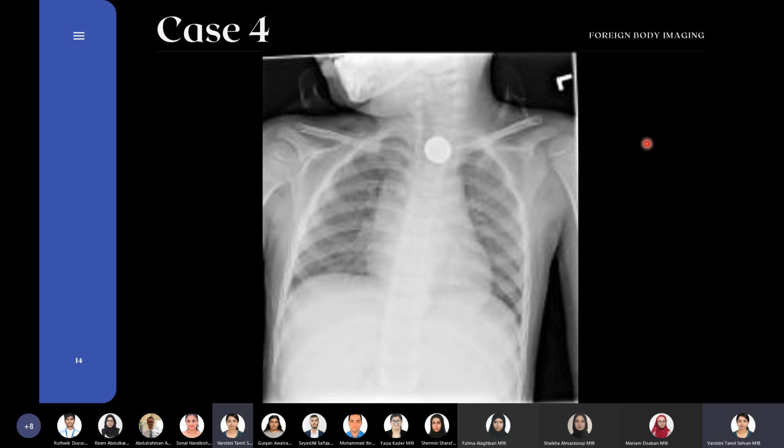Yes, this is an X-ray. Brilliant job. And what view is it? Is it a coronal view or is it a sagittal view, a transverse view? This is coronal, absolutely correct. So what do you guys see that's different, that's weird in this scan? Do you guys see any abnormality in the scan?